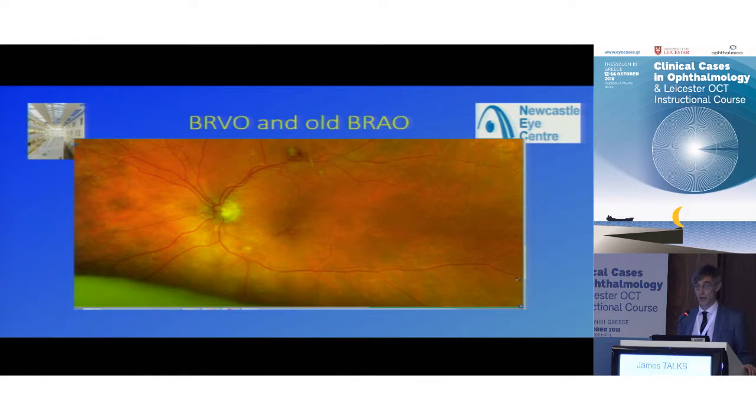So we're going to treat the vein occlusion bit of this, but we can't restore the lower part because the retina's gone. So by looking at the different levels in the map, we can get a better idea of the overall health of this tissue.